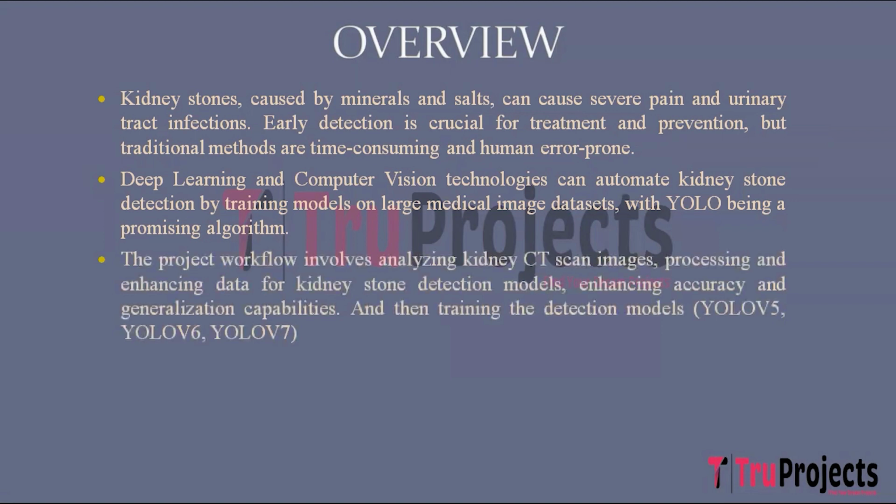So the workflow involves exploring the dataset, where the dataset involves CT scan images of kidney, followed by image processing and data augmentation. So the model distinguishes between kidney stone presence and absence, declares bounding boxes around suspected stone regions, and converts images into NumPy arrays for manipulation.